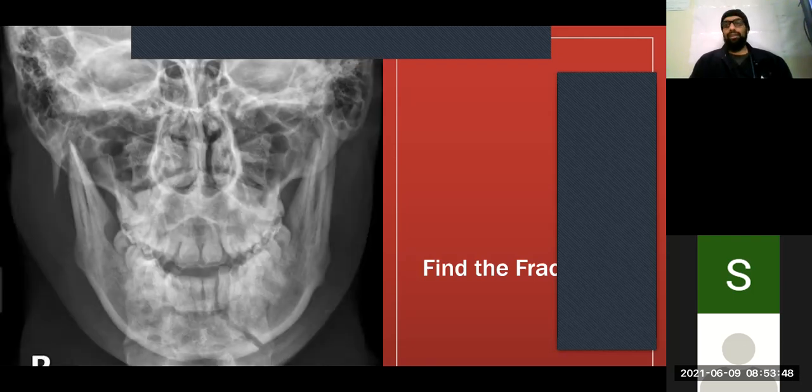This is a mandible fracture, by the way. So we're just going to cover the mandible a little bit. We're going to cover it in more detail next week, but I just wanted to show you guys this for now. So is there a fracture? Where is the fracture? Yes, there's 2 fractures. There's one here at the coronoid process, and there's one going through the mentis, or the main body of it. So when you're having a look at the mandible, always remember you've got to look at the entire thing, just to see what's going on. Now, what's the problem with this segment at the moment? Is it attached to anything? No. So does it have the possibility of collapsing?